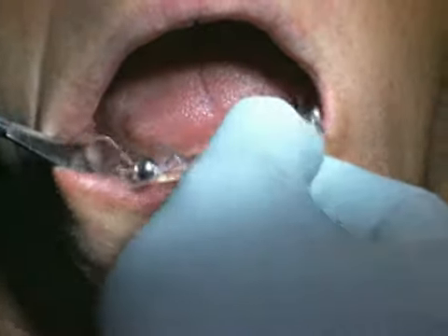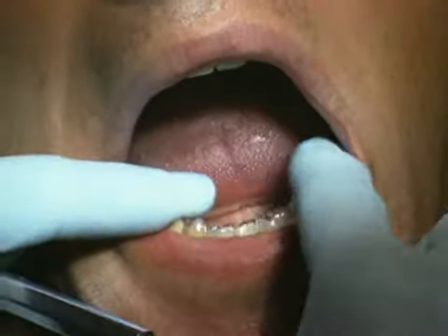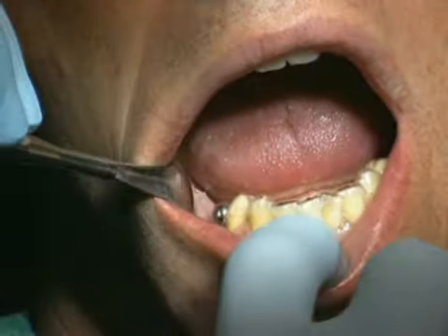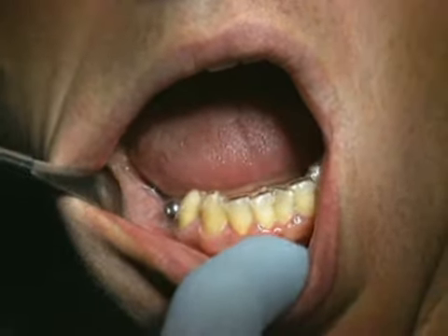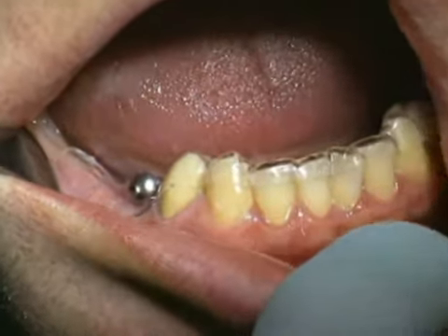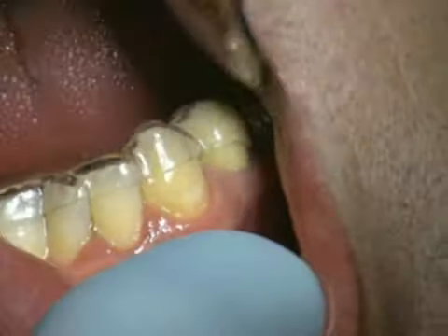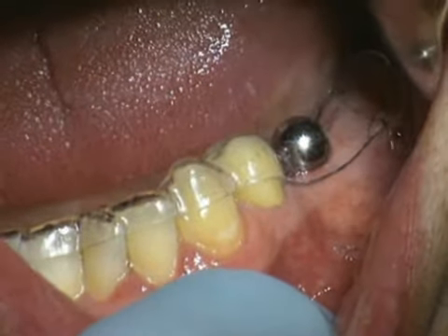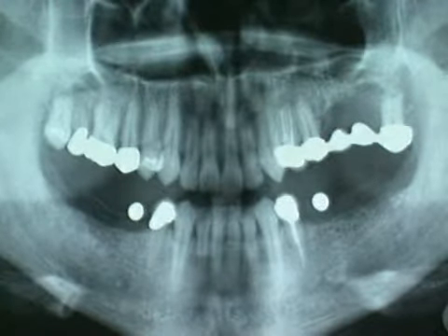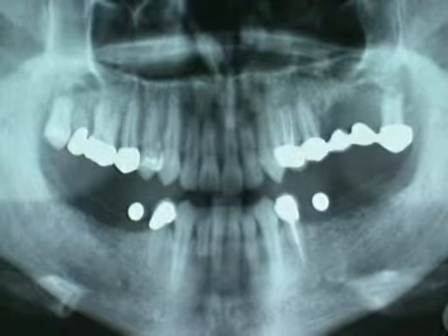The only way to obtain exact metric dimensions of available vertical bone substance is by radiometric means. To circumvent the imprecise magnification factor of 1.2 to 1.4, radiographic examination is performed with a custom-made deep-drawn measuring template featuring metal balls. These metal balls are 5 mm in diameter and serve as reference in the X-ray. The sharp silhouette on the radiograph supplies the reference value for the magnification factor.